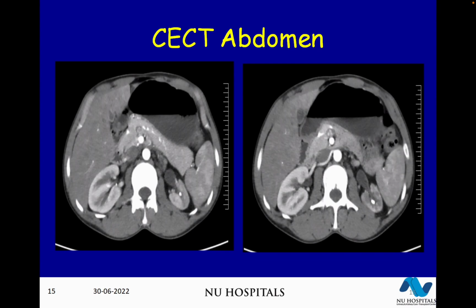And if it is a hypodense area with a cyst inside it, with calcification, other differential diagnoses should pop into mind, forget the fact that he's had ESWL and all the rest of it. There could be tumor also in a situation like this. Number two, if you do PCNL into this, there could be a nephrocutaneous fistula. This may be a blocked infundibulum and therefore is blown out and there's collection inside.